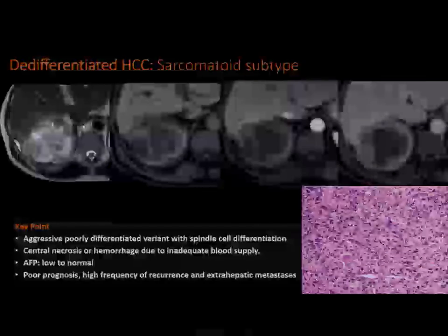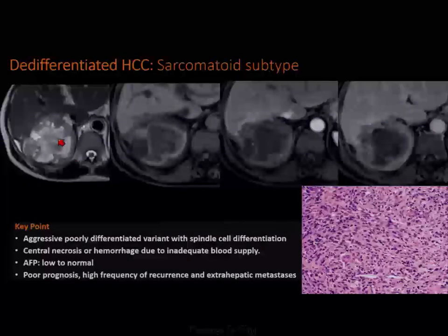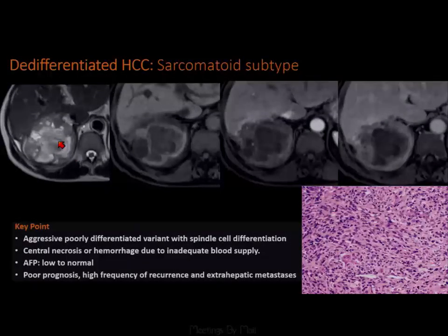This is another case at our institution that grew in a matter of 2 months to this size, almost quadrupled in size. It started to invade into adjacent structures, with a similar imaging pattern. And on pathology, they see distinct spindle cells.